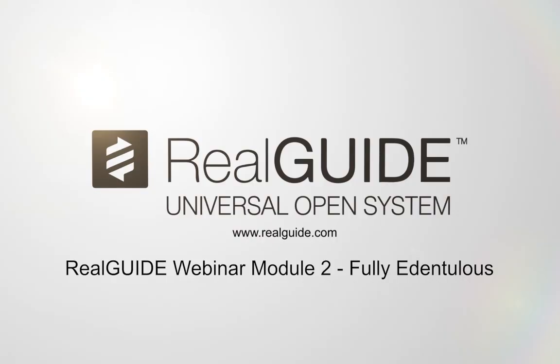My name is Lee Austin. I'm a digital technology specialist. I'm also a dental technician, CDT with a biology degree, a degree in removable prosthetics, and also a mastership in implant prosthetics. And I'm going to be going through the RealGUIDE software today and talk about how we plan for fully guided, completely edentulous patients, whether we're doing all-on-4 restorations or implant retained tissue supported overdentures, what have you.